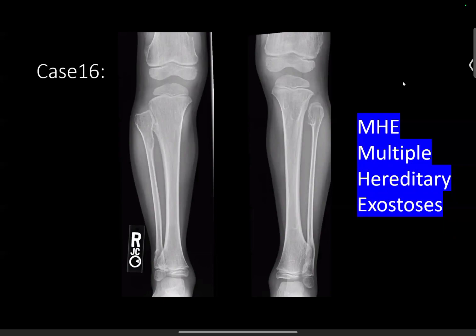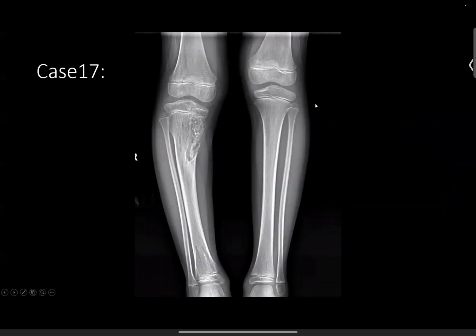Excellent. There is a very small risk of malignancy, and we want to follow them for any growth. They can grow throughout skeletal maturity. After skeletal maturity, they really shouldn't grow or cause new pain. This is one leg. There was a leg length discrepancy.